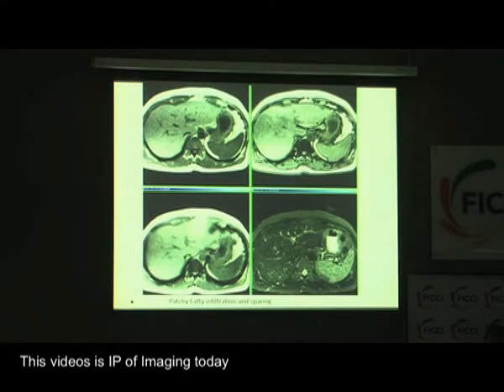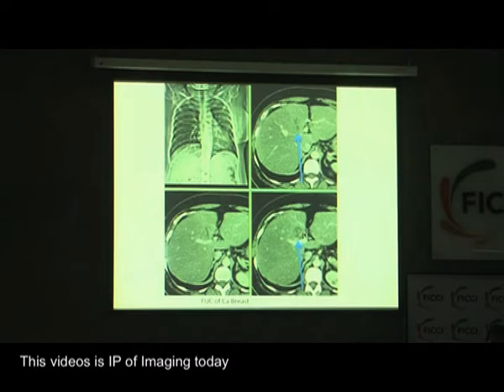Fatty infiltration can be patchy and geographic. As you can see in this patient, on all other sequences other than the opposed phase, you can see that there is just pretty much a normal parenchyma.